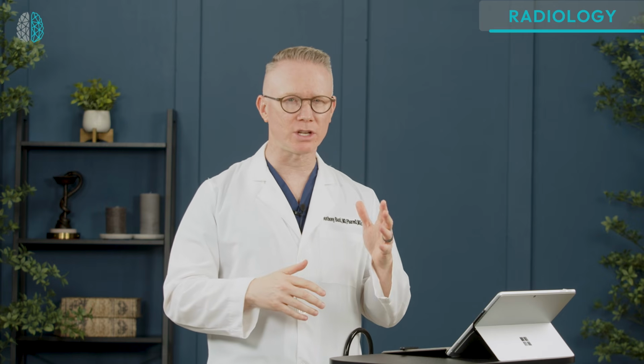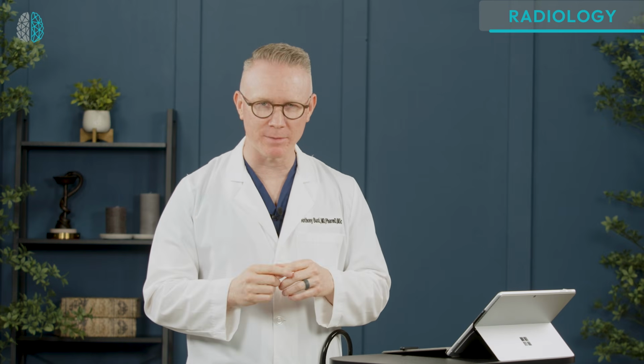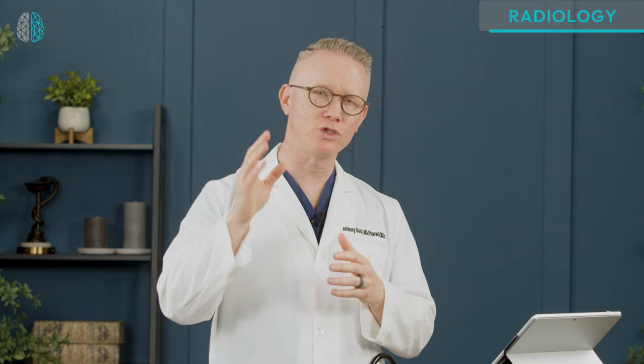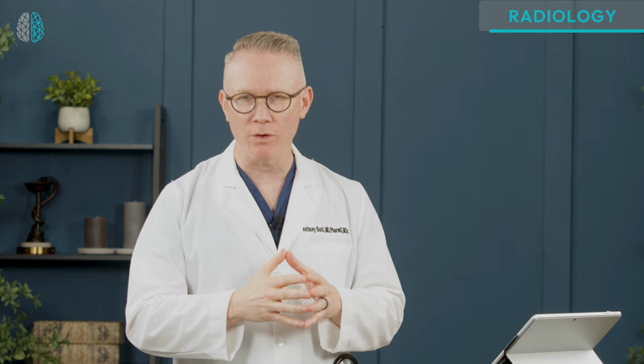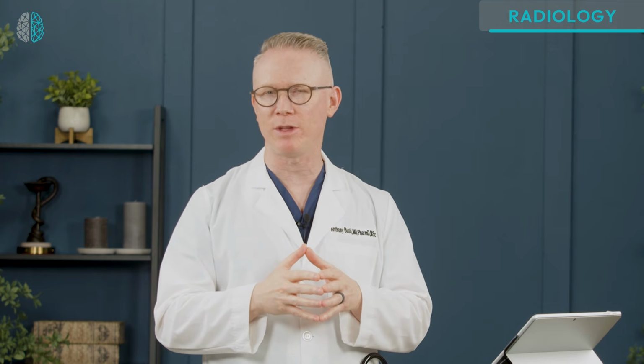So let's address the first, projection and posture. That starts with knowing what type of chest x-ray image it is and, even more importantly, how it was obtained. Now, for those of you joining us via the podcast channels, I will do my best to walk you through this, but you may have to move over to the video if you want to see some of these images if you're not as familiar with them, okay?